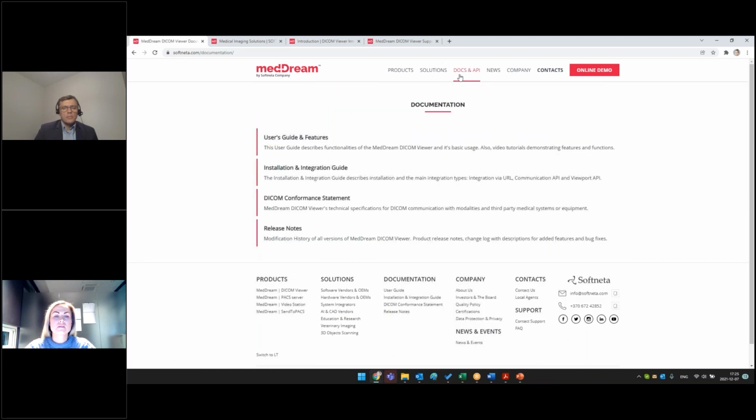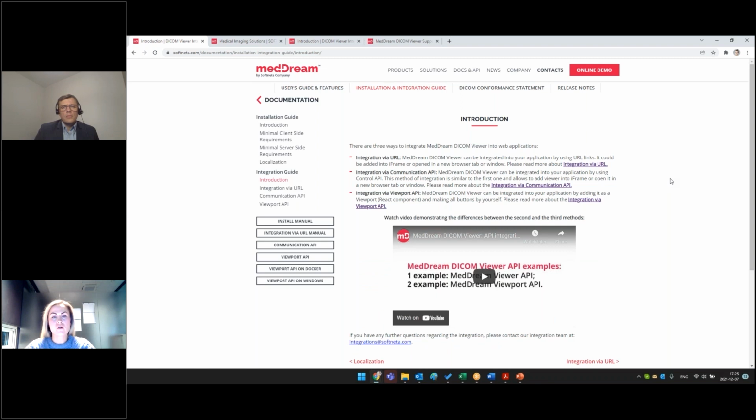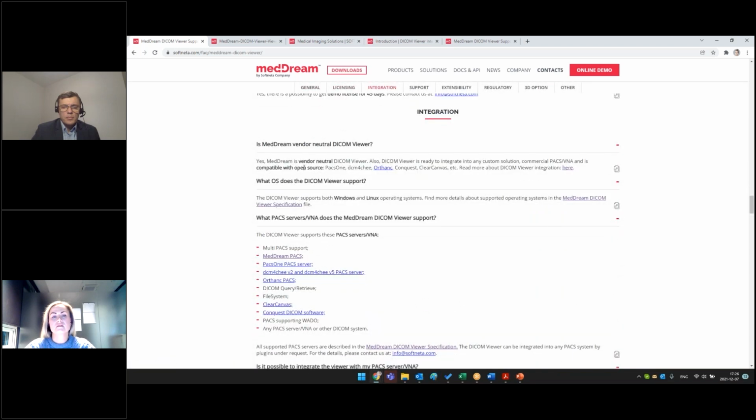Also, we have the installation and integration guide on this page. So I want to show this section, the integration guide. It's a new section. More information is now under preparation, and we're going to extend this page. Here you can see video, links to the different types of integration, and also documents. Just click and you see the document. Also, maybe you didn't see, we have a frequently asked questions page, organized by themes. Integration also has a separate section, and if you have questions, maybe you can easily find answers in these.